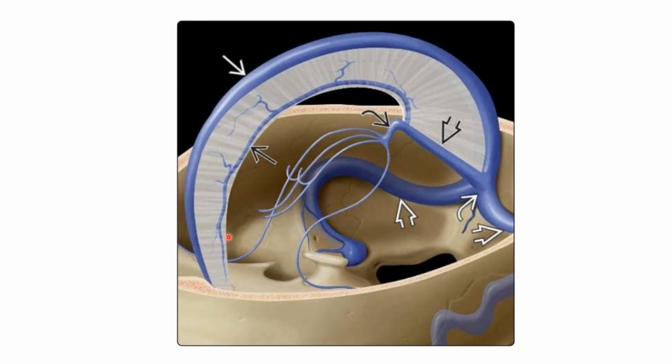So this is the dural sinus venous anatomy showing superior sagittal sinus and the inferior sagittal sinus with the straight sinus here, and this forms the venous confluence and transverse sinus, and then continuing as sigmoid sinus bilaterally.